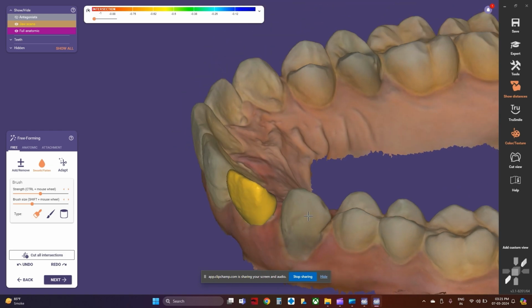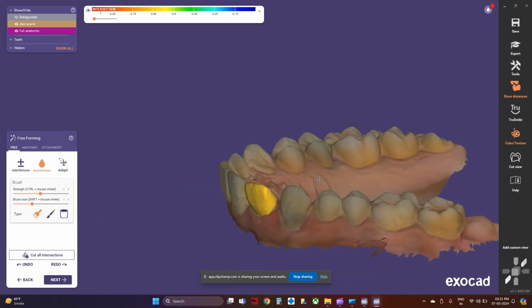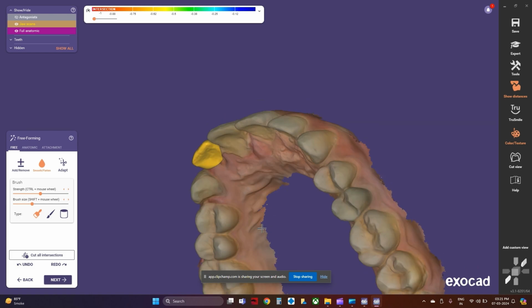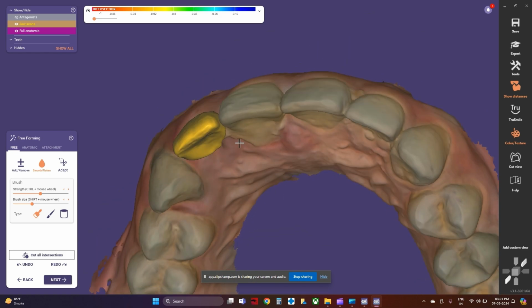Another way of doing it would be to place the implant, place the abutment in its position, and then scan and directly get a temporary made. This would allow us to give a temporary immediately to the patient and then reline the internal part of it to completely condition the soft tissue.